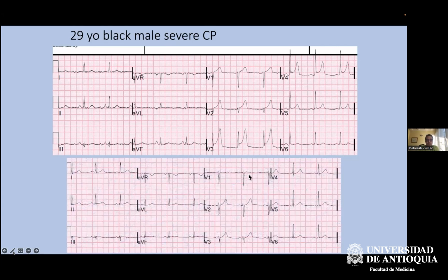And then the patient's chest pain went away and his EKG findings resolved from this to this. When they saw this, they knew, this must be LAD occlusion. This is spontaneous reperfusion. Now the artery's open. Now they're worried about the patient because they realized his LAD was occluded here. So they went to the patient's bedside, and on their way to the patient's bedside, he had a cardiac arrest. He could not be resuscitated. He did go to the cath lab while CPR was in progress. They shot his LAD. His LAD was completely occluded, but they could not get it open or resuscitate him. So he died.